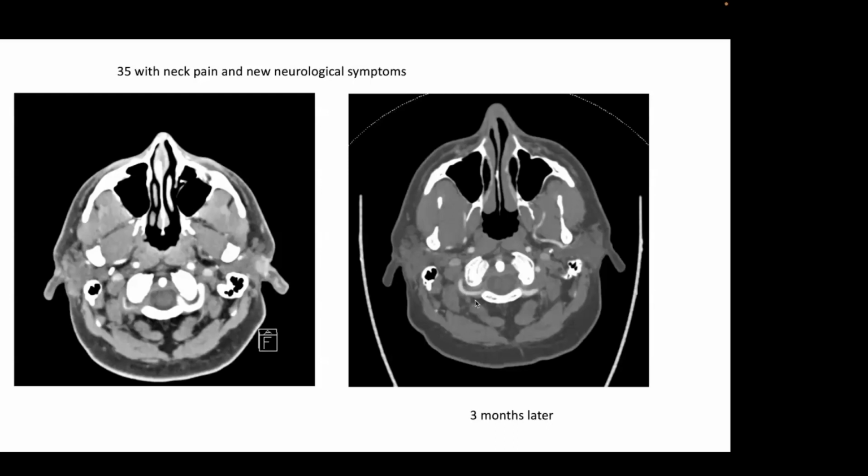So most often in patients with vertebral dissection, particularly in trauma patients and in young patients, the lumen usually recovers. So the vessel goes back to a more normal appearance over time. Now, I will tell you there's one pitfall that you will see. Sometimes there can be veins. If you have a patient who has a hypoplastic vertebral artery, meaning the same caliber all the way down to its origin, sometimes you'll see unopacified veins that sit behind the vertebral artery. That is probably the most common pitfall I've seen where this gets overcalled or a false positive.